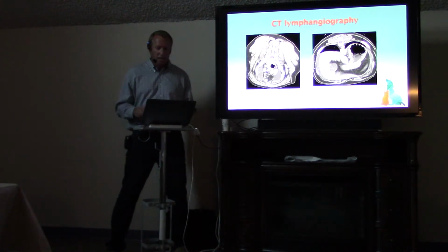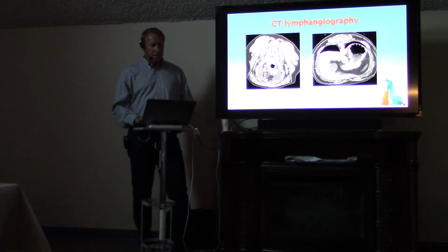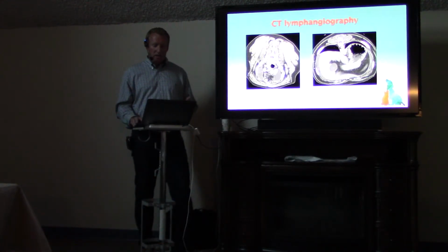And then this is an actual case that I was involved in. This is the pre-surgical scan, and this is up in the craniomediastinum, and you can see all these small dilated tortuous vessels up there, and these are all little lymphatic vessels. And so you certainly don't want to try to go up into the craniomediastinum and ligate all those vessels, and that's why we go caudal-dorsally where there's fewer vessels to try to ligate. And so back in the caudal-dorsal portion of the thorax, again, in this dog, there's 3 separate vessels that were identified. And so this is where the surgeon chose to go in and do the ligation.